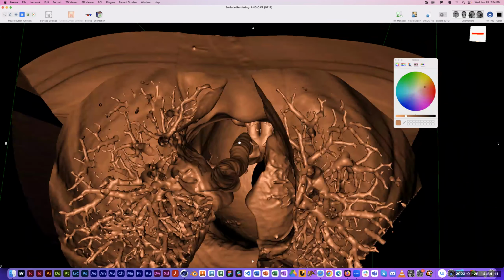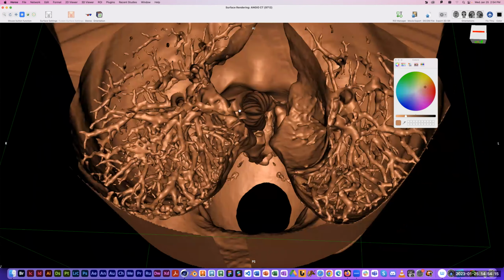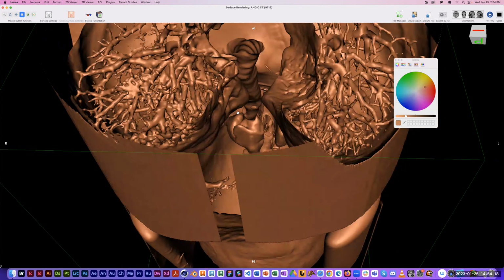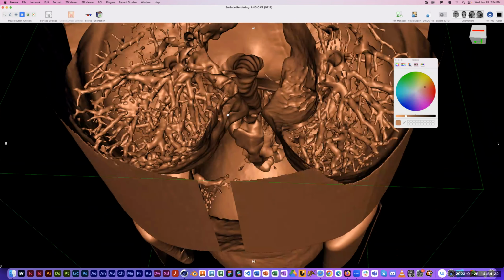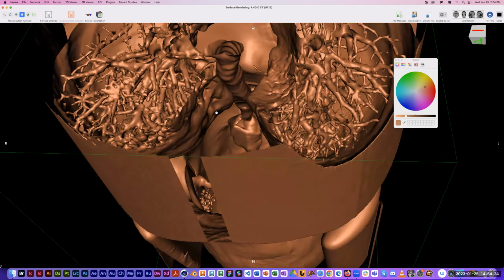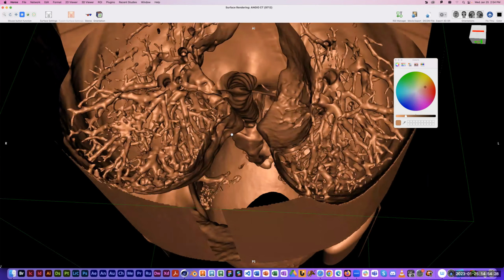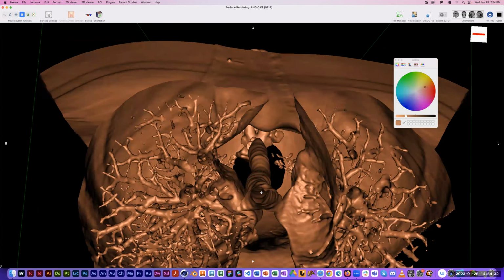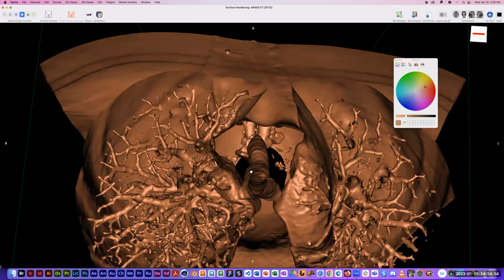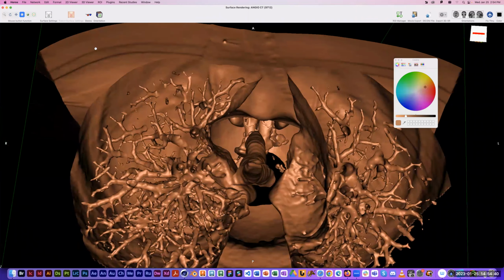And you can actually see, if you look way up in there, we've got things like the maxillary sinuses. We've got different parts of the nasal cavity. We've got the pharynx and the larynx. Here's obviously the trachea. You can tell from the ridges on the trachea. And then you can see some of the bronchi extending into the lungs.